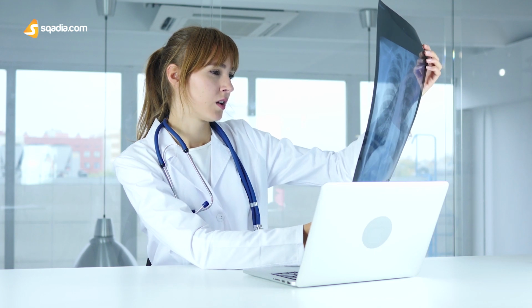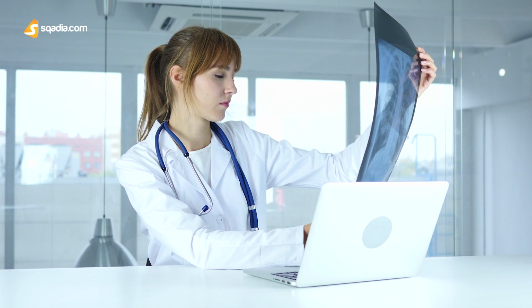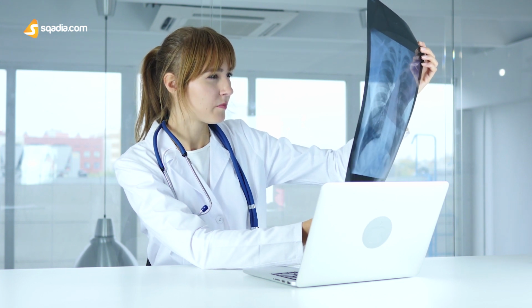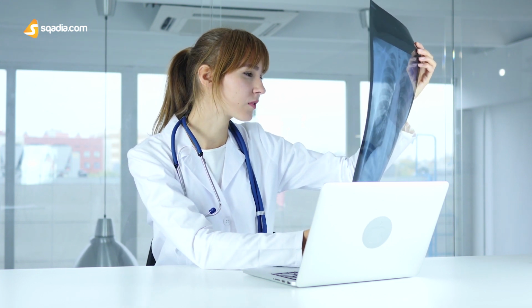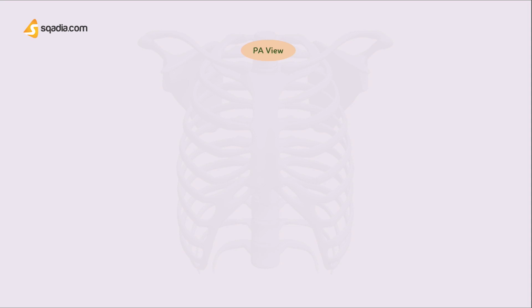Hi guys, did you know that the chest X-ray is the most common requested radiograph in hospitals? It is almost crucial that every doctor knows how to read a simple chest X-ray, and since you will probably see hundreds if not thousands of chest X-rays in your rotations, let's try to get a better hang of it. Now, before we jump into all the different pathologies identified on radiographs, we need to go back to some basics.